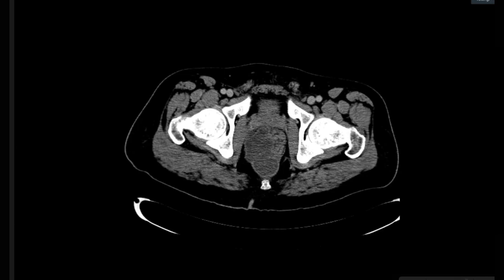And if I can take some clinical history of the patient, if the patient is of old age, it can be a malignant looking lesion, but it's not very malignant looking because there is no circumferential thickening. I would like to first confirm the clinical presentation, if there is any history of fever or other symptoms, to rule out some inflammation or an abscess in this region.